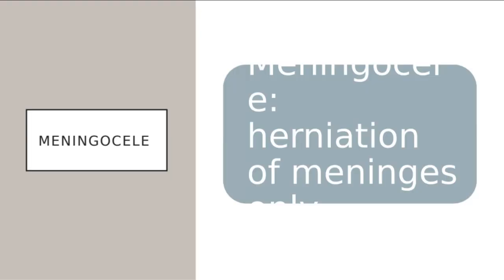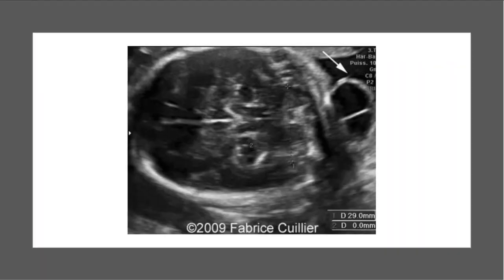So now a meningocele, like we said, is when we just see that herniation of the meninges coming through. It's going to look a little bit more cystic coming out, and that's exactly what we have here. So again, pretty obvious protrusion, but a lot more cystic than that first one. So that's the classic meningocele appearance. Now we will come back to meningocele and the variations of what a meningocele can be if we're talking about just the spinal cord towards the end of this PowerPoint.